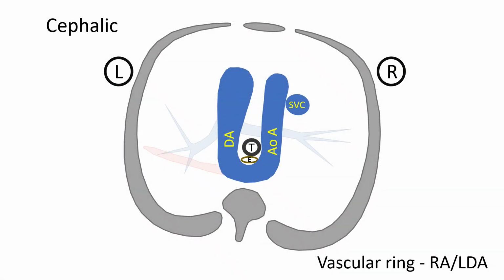Now onto vascular rings. This is a right arch left ductus arteriosus subtype of vascular ring, where we have the U sign. And so here we see that the aorta is to the right of the trachea, and you have a posterior coursing ductus arteriosus. And then I've added in this aberrant left subclavian artery that we typically see with this subtype of right arch left ductus, and then the pulmonary arteries here are seen in the distance. But this is classic U sign that we see in this view, and you'll see that with the color Doppler.